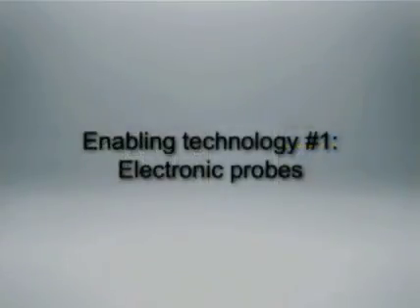The first enabling technology that I'm going to talk about here is fully electronic probes or transducers. Because of their construction being all electronic with no moving parts, they can be lighter, they acquire volumes faster, and they produce higher resolution images. Here's an example of one such probe that we have in our lab. And although it's not quite as small as I'd like it to be, a little bit smaller than this, it's certainly a big improvement over the large, bulky, heavy mechanical probe I showed you earlier. And it has no moving parts in it.